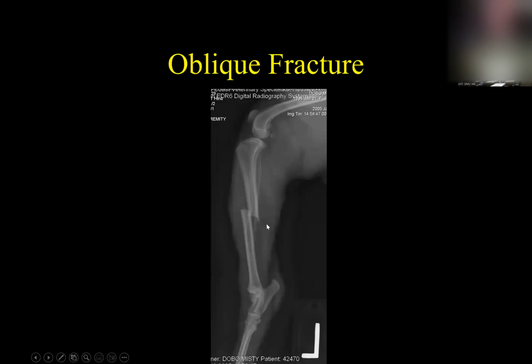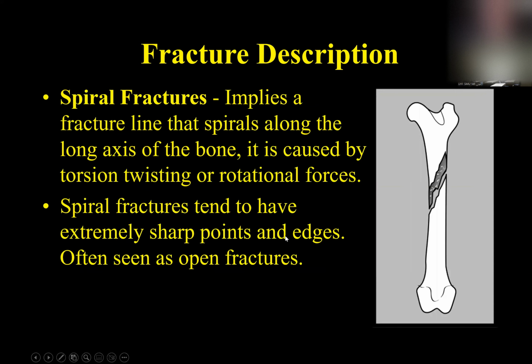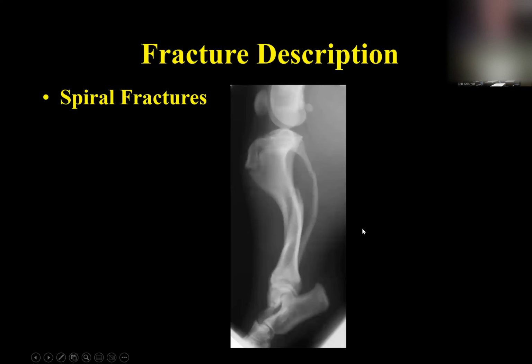Okay, here's an oblique fracture through this part of the tibia. Okay, that's a long oblique, spiral-like fracture through that part of the bone as well. Okay, here's another long spiral fracture. He's also got a fracture here of the adjacent fibula and another one of the fibula there.